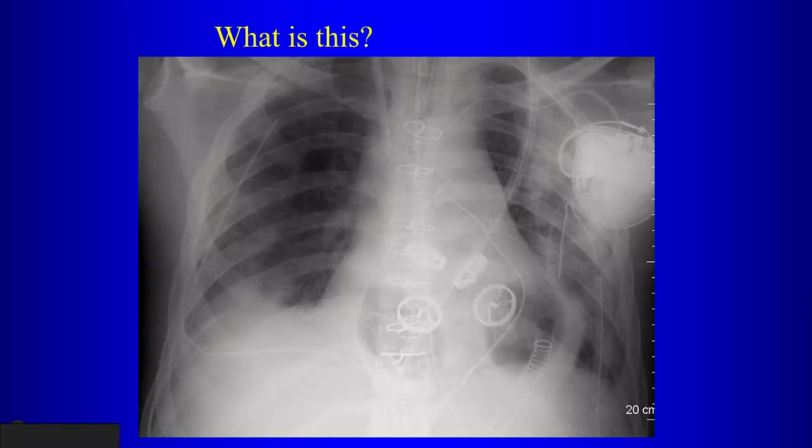Real weird looking device here. What is going on? What is this density? What is that? Air. What's going on? So what is this? It's a transplant. Well, you're kind of beating around the bush. You're not telling me what this is. What device is this?